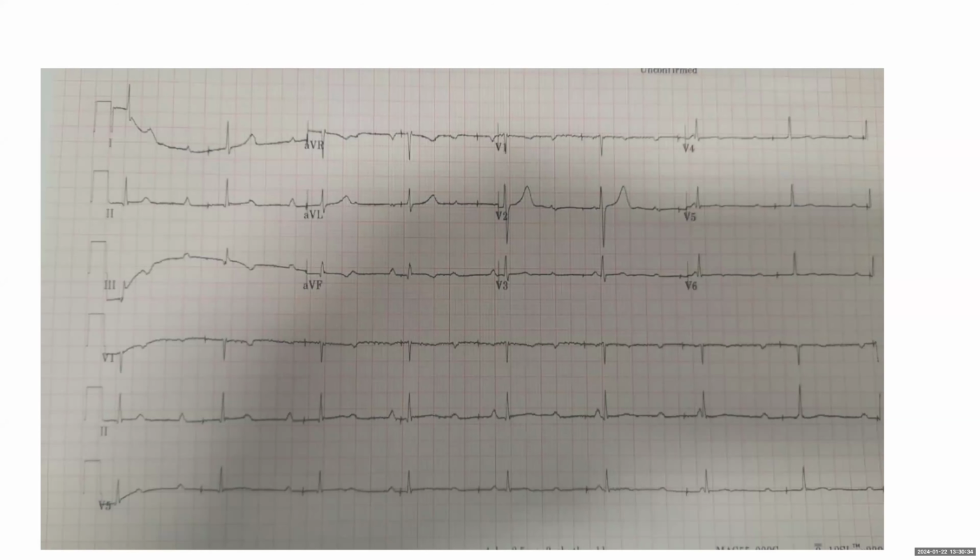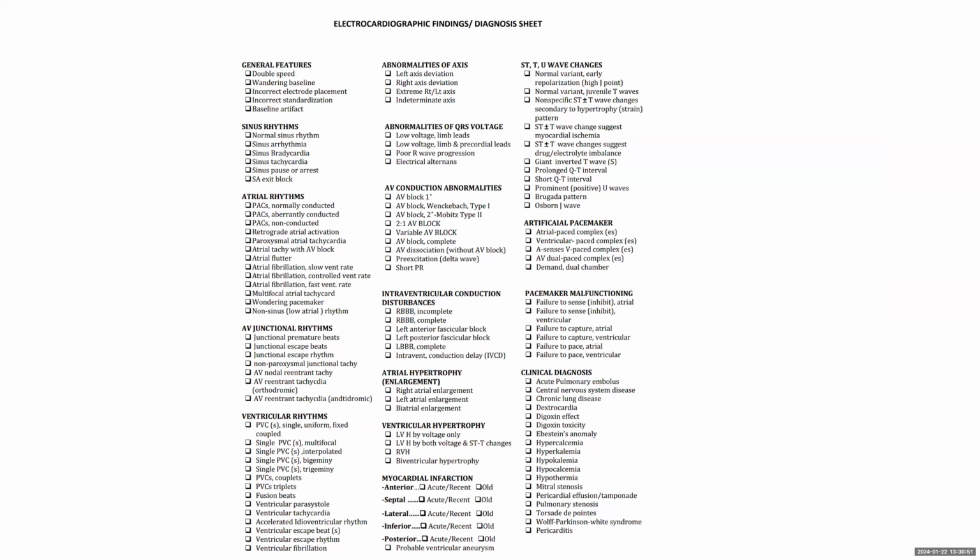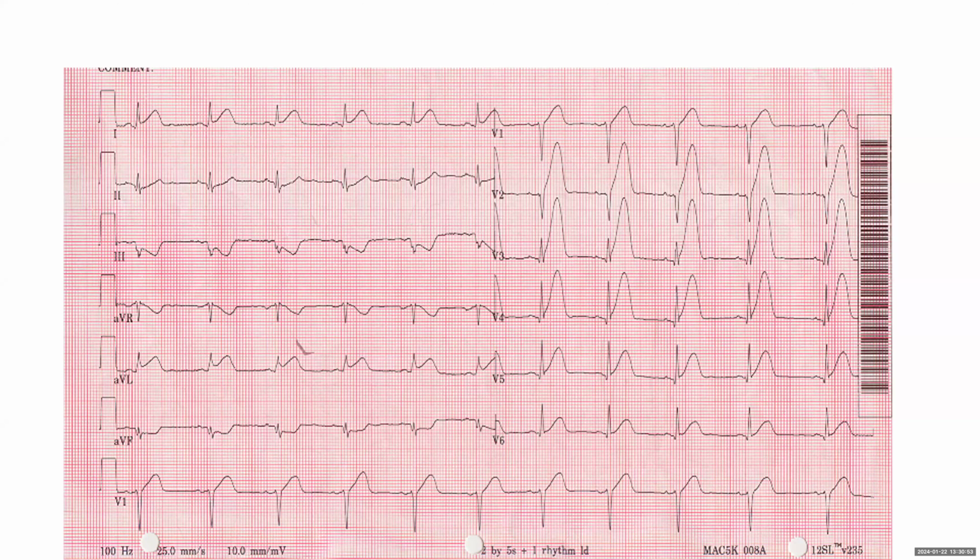Okay. Any questions about this ECG? Yeah, excellent. Okay. Next ECG. So I'm going to go back just one sec.